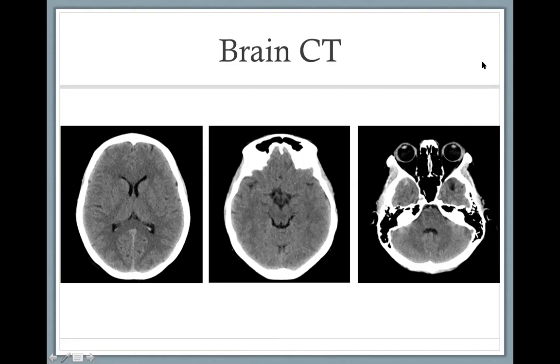Yeah, great. Okay. So fat, I'm not sure about the answer of less resistance, but I would agree that it is fat that makes it lower attenuation. So it's actually soft tissue with lots of fat because of the covering of the axons in the white matter.